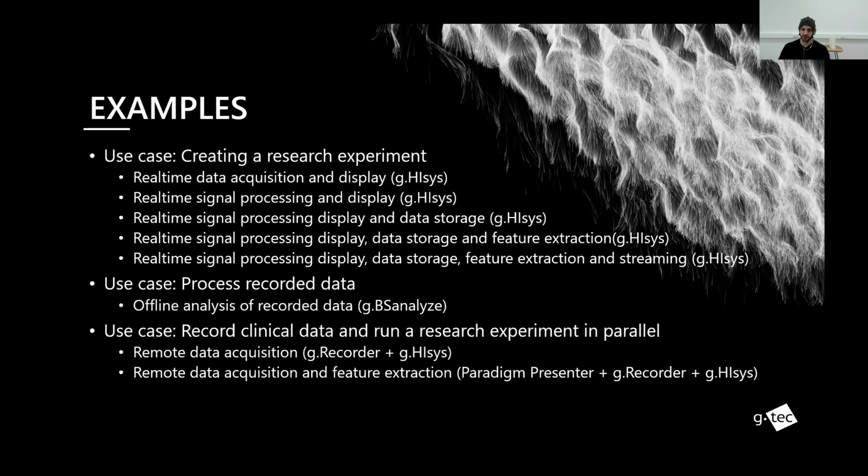That's usually used when g.recorder is used in a medical or research environment and is recording some patient data. But you also want to run an experiment in parallel, then you can record and run the BCI with g.recorder, but in parallel, you can do some research signal processing in g.HIsys. Therefore, I'm going to show you how remote data acquisition works using these tools.